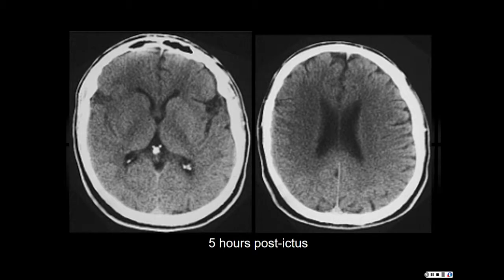I showed you the MCA sign. This is the cortical ribbon sign. The cortical ribbon sign is the result of loss of gray-white matter differentiation when you have edema or tissue injury in the area. Everyone got that?